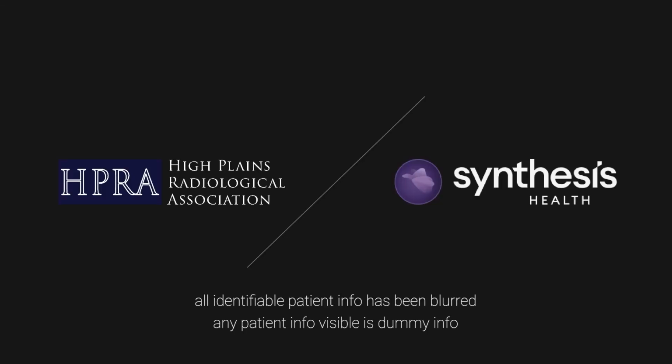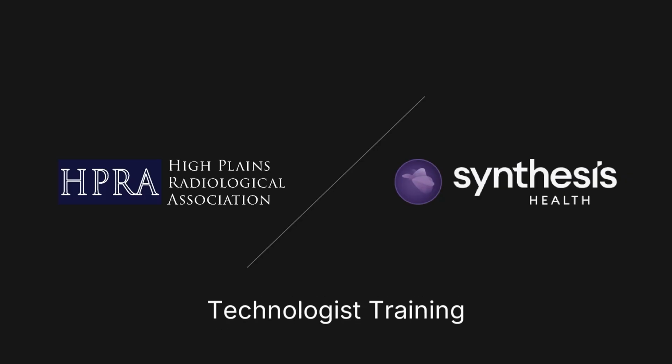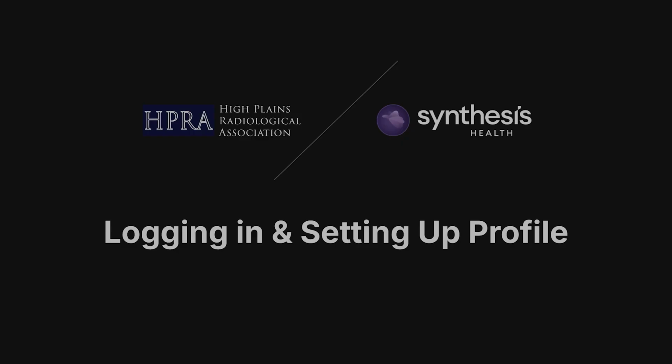Hello, and welcome to the Technologist training for Synthesis PACS, which is the PACS that HPRA will be transitioning to in July 2025.